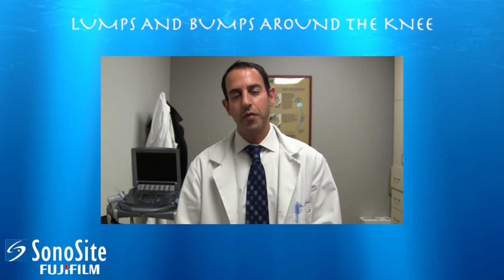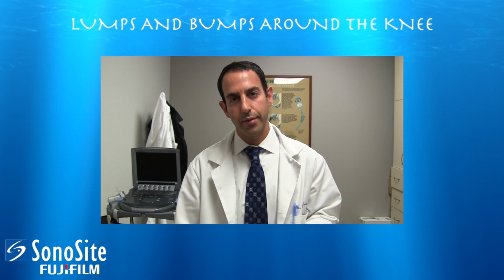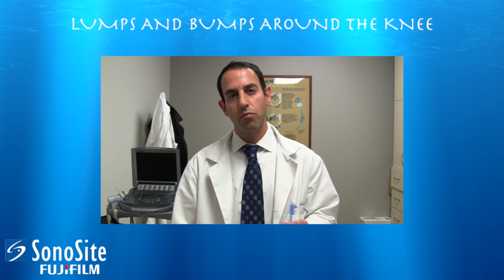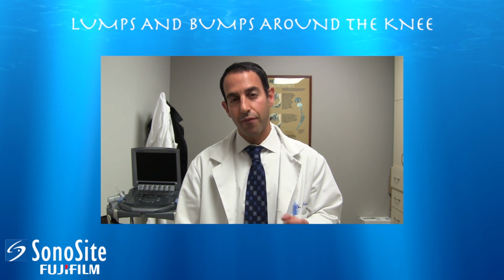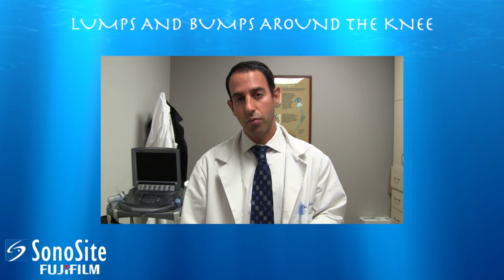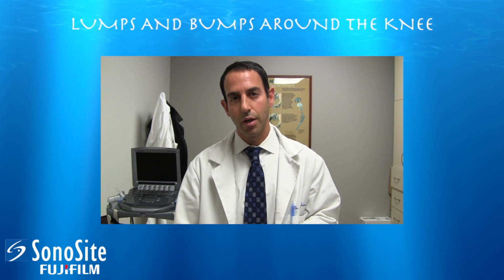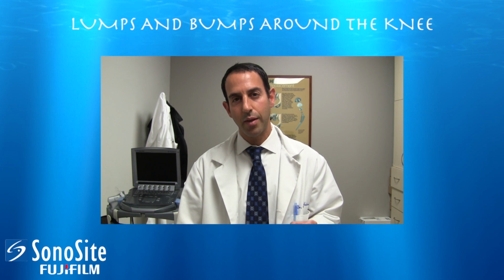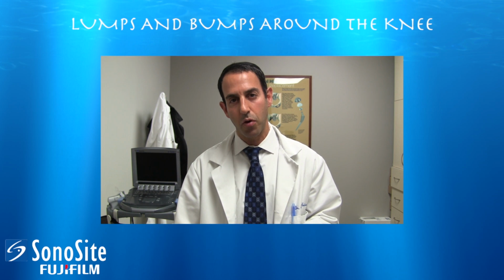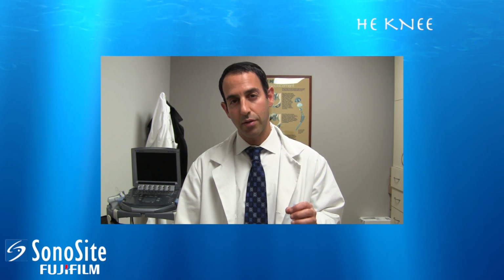Here's a case of a 56-year-old female complaining of about 3 months of pain in her left knee. She had pain with walking, she had no mechanical complaints. And ultrasound did reveal a ganglion just medial to the semimembranosus tendon. On physical exam, she was tender in the pes bursa region, also in the medial joint line, so I think there was some pain referred from this ganglion. It's important not to diagnose this as a Baker cyst, as it does not lie between the medial gastrocnemius tendon and the semimembranosus tendon. And you have to have a fairly keen eye in order to identify this.